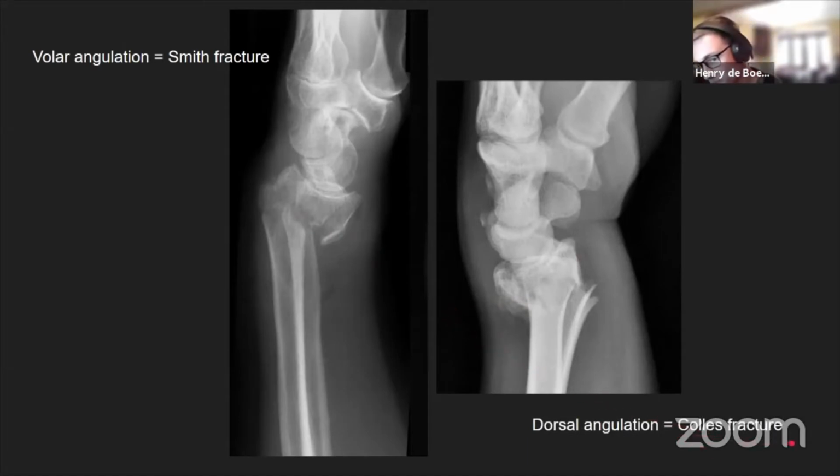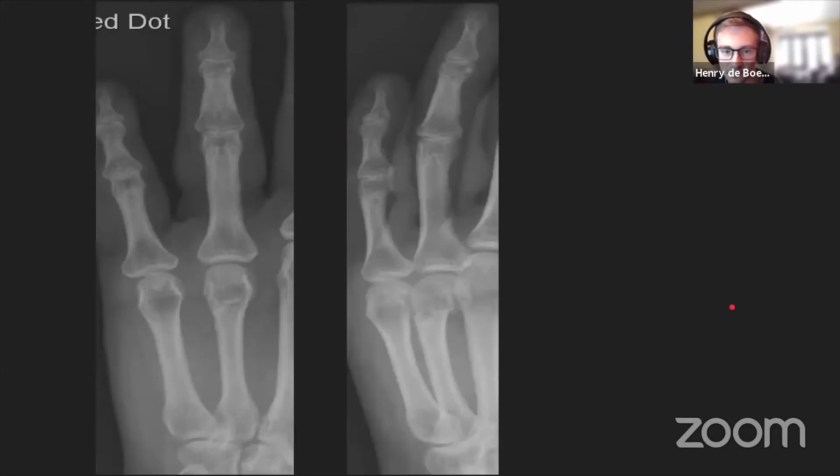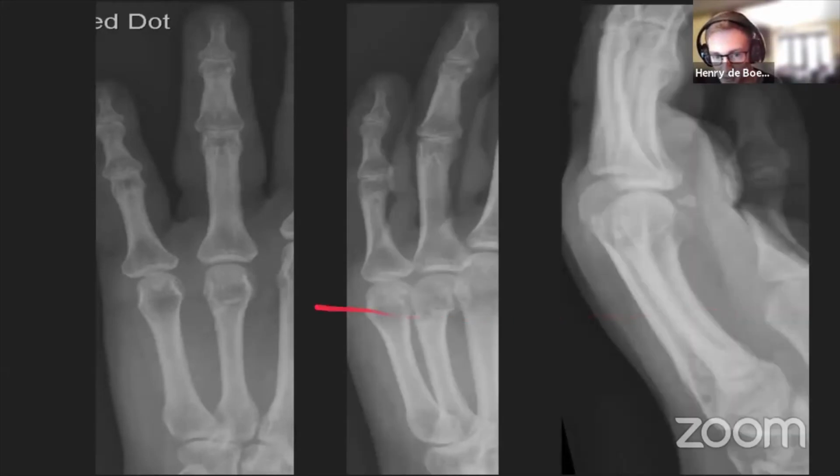Again, I don't think it's important to remember the names, but people will ask you, well, what's that? So that's why I put them in. So, next case. This is just one series of films from the same patient. I'll give you 30 seconds to a minute.